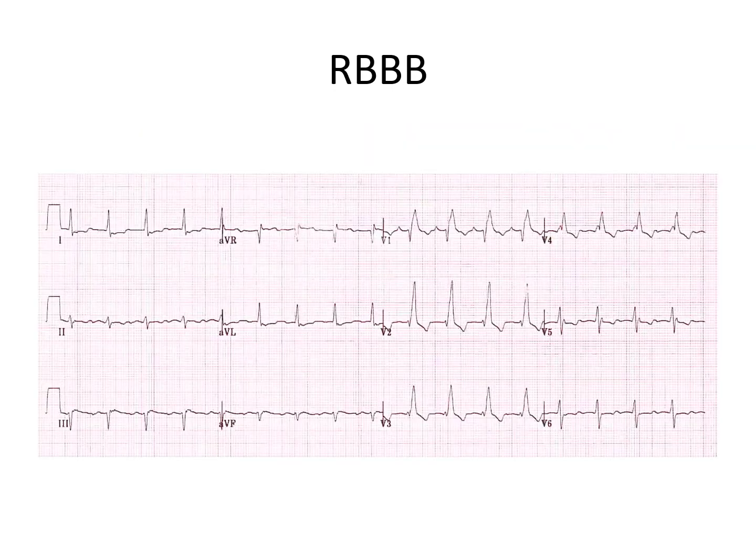So let's look at an example of a right bundle. You will see the same pattern repeating itself, but mostly in the leads that are looking at a right ventricle. Now in this particular RBB, the morphology is very pronounced. It goes all the way to V4, but in V1, V2, V3, V4, you can see a clear pattern of an upright QRS followed by a downsloping ST depression, essentially, and then it's far less pronounced in all the other leads because the RBB, if you'll remember, only affects the leads that look directly at the right ventricle.